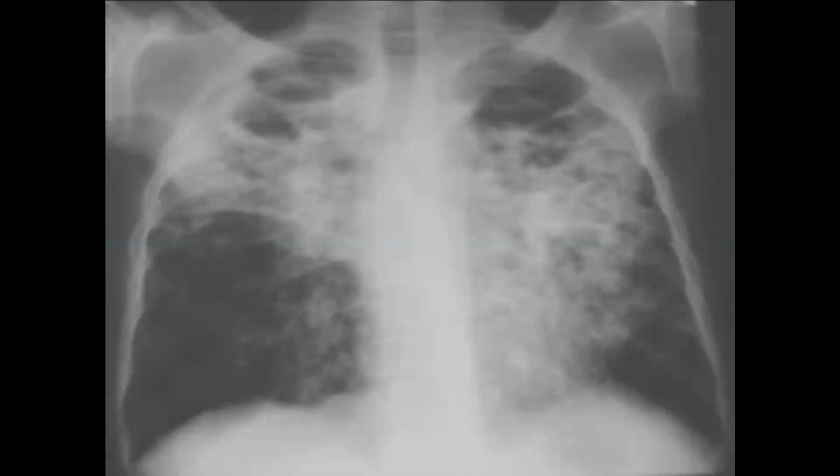So let's discuss this diagram. This chest X-ray is showing post-primary TB. One thing that I really wanted you guys to take note of is the patchy bronchopneumonia. Are you able to see this? Patchy consolidations. Yes, and the other important thing I want to show you is the cavitations. If you're able to appreciate, there's a cavity here, then there's another cavity here, and another one on top.